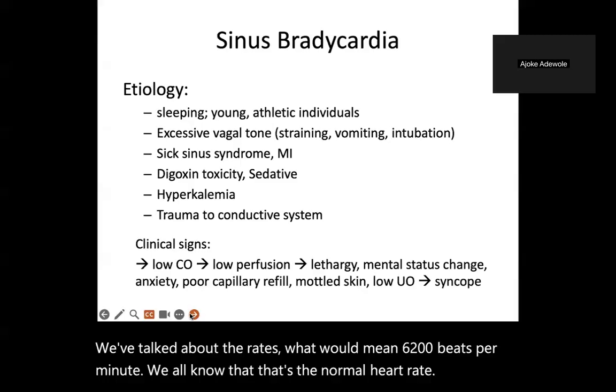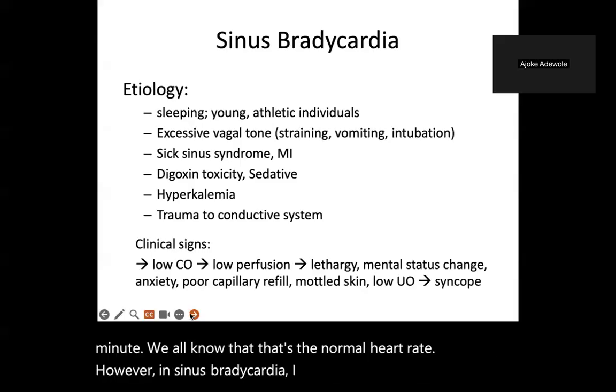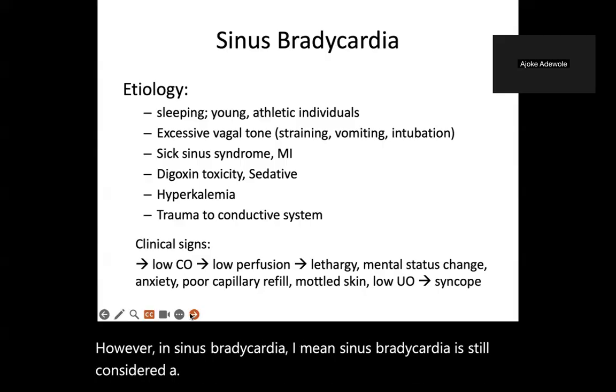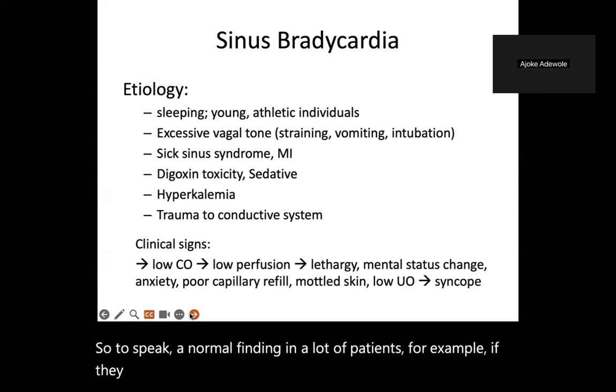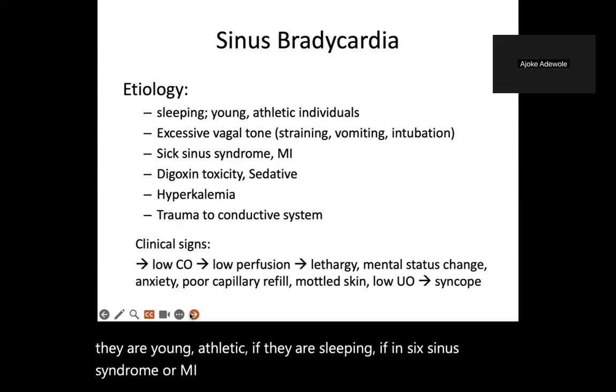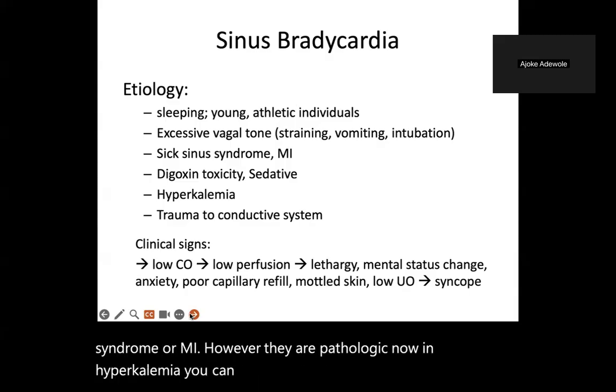However, sinus bradycardia is still considered, so to speak, a normal finding in a lot of patients. For example, if they are young, athletic, or sleeping. In sick sinus syndrome or MI, however, it is pathologic. In hyperkalemia, you can have sinus bradycardia as well.